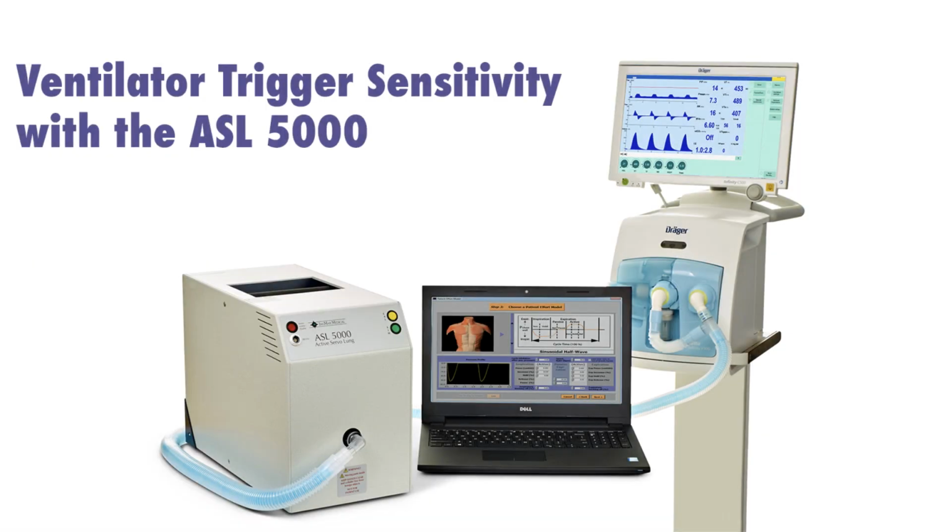Trigger sensitivity. So what is actually trigger sensitivity? You can have, of course, two types of triggers, pressure trigger and flow trigger. But for each of these, you will have to go over a particular threshold for the ventilator to actually see the effort that a patient is making.